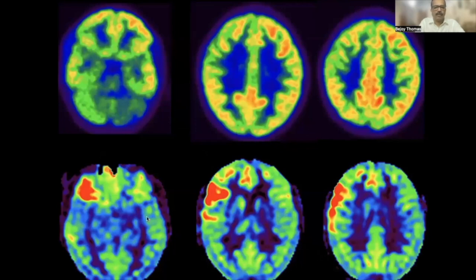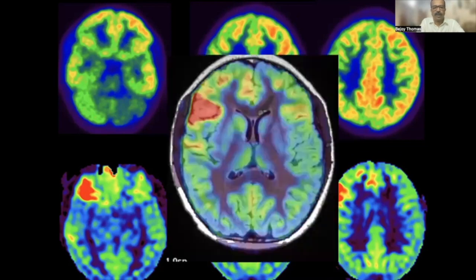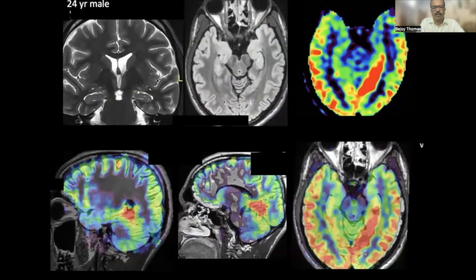This ictal, periictal perfusion ASL image, you can see very high perfusion in this area. So also you can see that it is actually spreading more posteriorly. So the perfusion may not be exactly showing the substrate itself. There can be significant spread, and if electrical activity spreads, corresponding perfusion increase also can happen. So it's again how interictal PET as well as ictal perfusion imaging is actually helping us to localize in this case, and this case was proved to be autoimmune encephalitis.